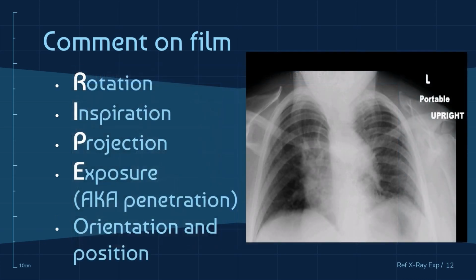Finally, you should not forget to also comment about the orientation and the position. Orientation means that this is the left side of the patient and this should be the right side. This should be labeled on your film. And also the position: it is upright or erect, and it can also be supine in other cases.